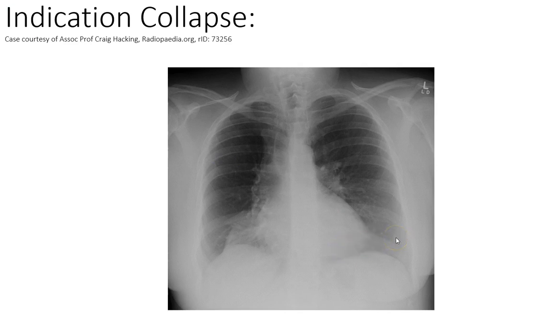Okay, so this is another film looking at atelectasis collapse. So again, checking the spinal column, is it nice and straight and central? Again, we lose sight of it here. It looks like it's probably fairly straight, fairly central, but this is a whiter film. We can't see the intervertebral disc behind the heart, the spinous process and the clavicular head. And there's a little bit of rotation, but less, I think, than in the previous film.